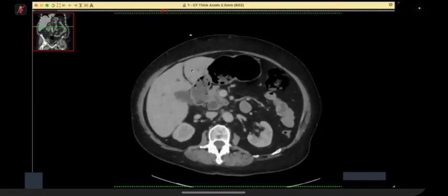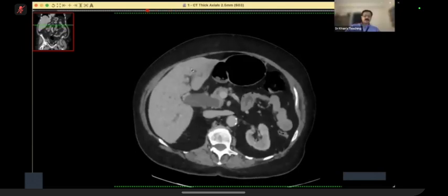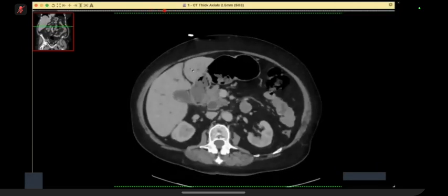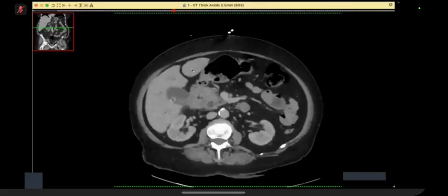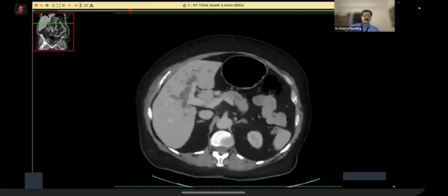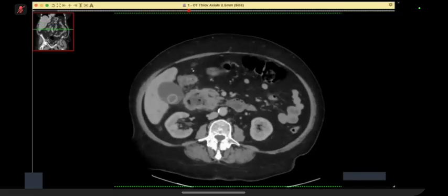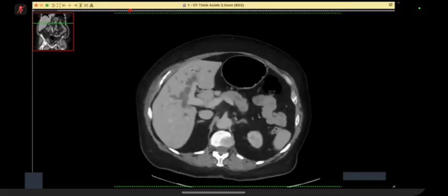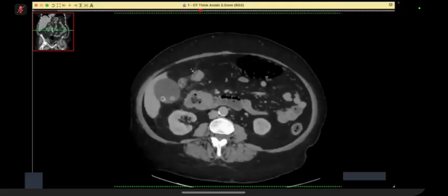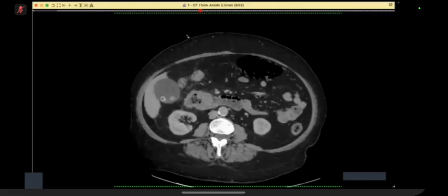Yes, sir. Sir, can I look at the arterial phase? The arterial phase is not available. Okay. Why do you need an arterial phase? Just to look for any carcinoid, to rule it out. So my final diagnosis would be periampullary CA only in this case.